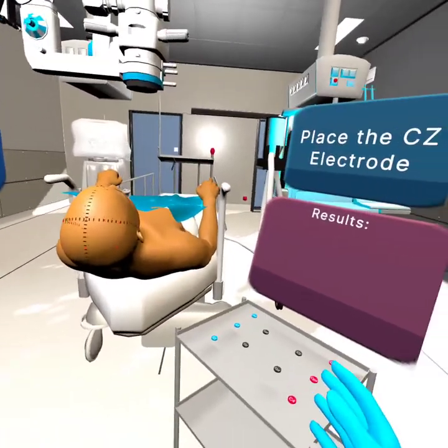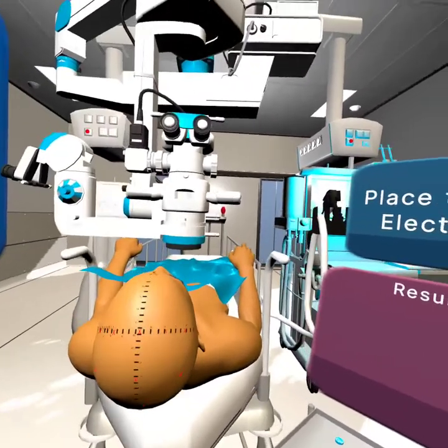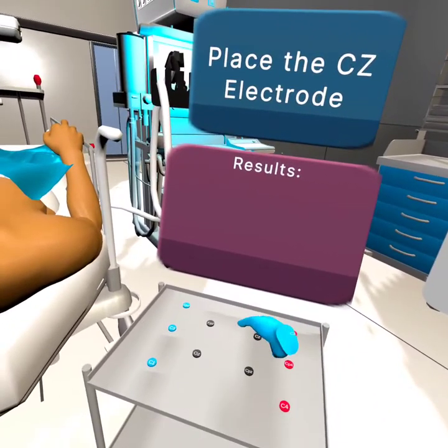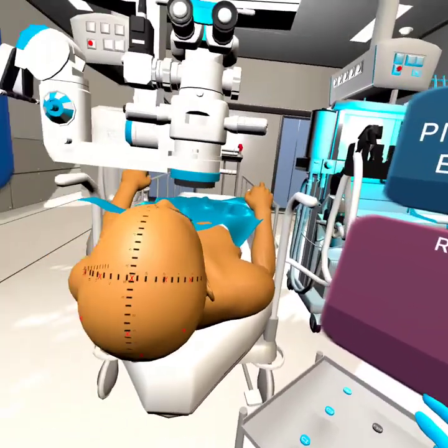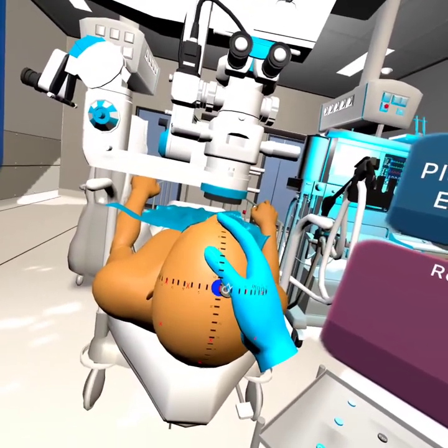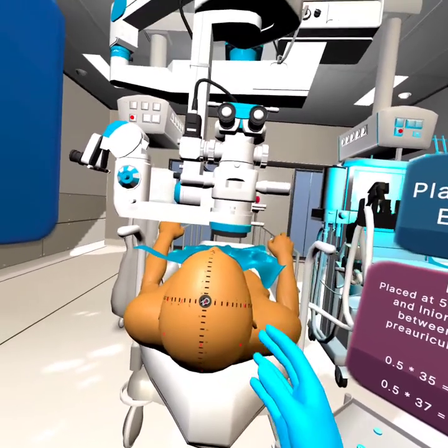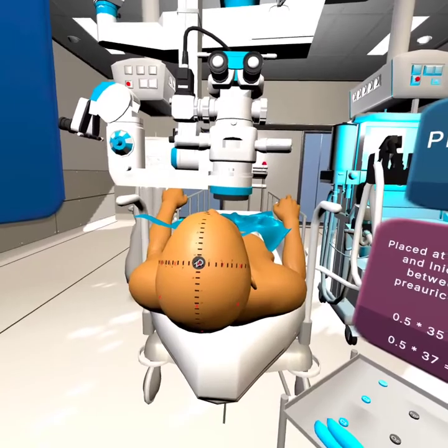The second practice mode room is slightly more complex. This is a simulation of electrode placement. First, they start with the CZ electrode and learn how to use the little marker hints to place the electrodes as appropriately. These electrode placements follow the content as discussed in learning mode.